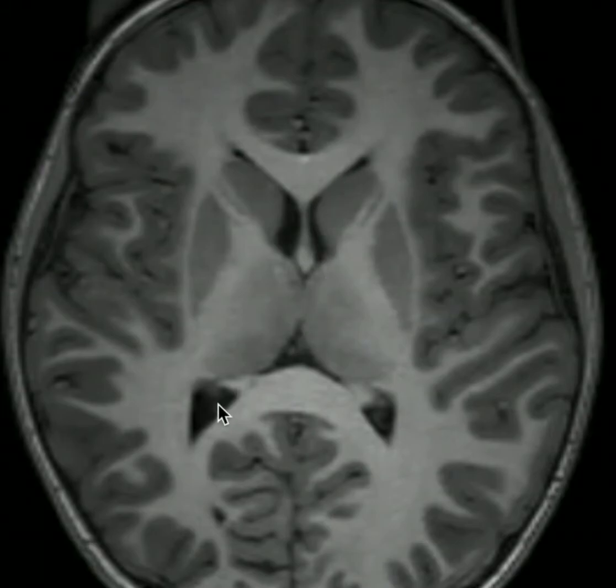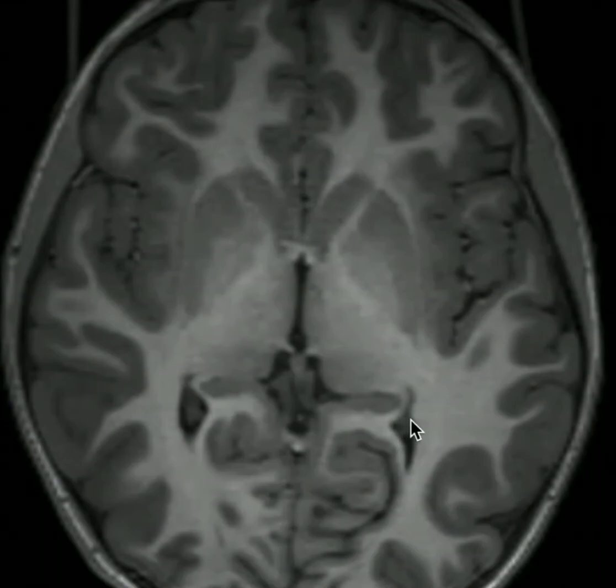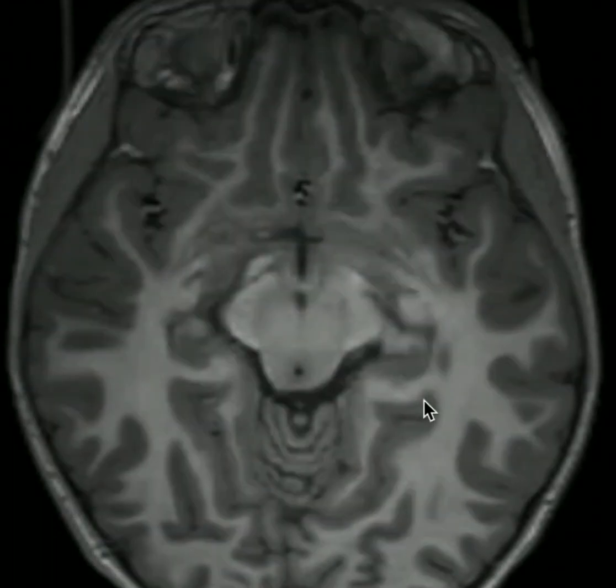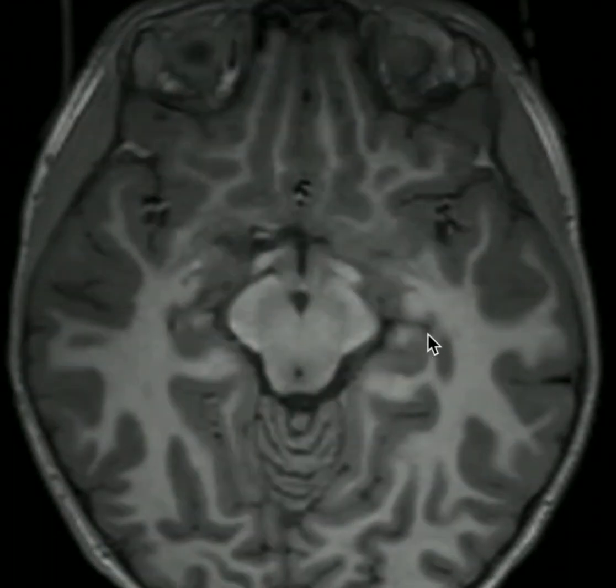More posteriorly, we have our occipital horns going down into the occipital lobes here on the right. And here on the left, we'll see this better if I scroll down just a little bit to see this occipital horn. The point at which the occipital horn and body of the lateral ventricle, as well as the temporal or inferior horn, all come together is known as the atrium or trigone of the lateral ventricle. Scrolling further inferiorly here, we'll see our temporal horn coming off anteriorly at this point. It is going to course right next to our hippocampal head, as we discussed previously.